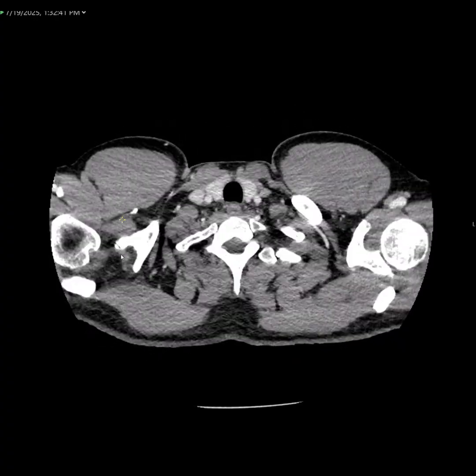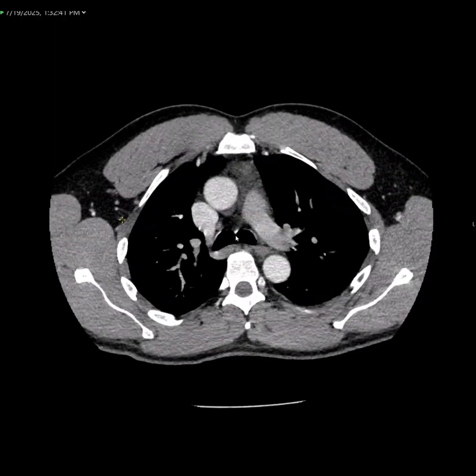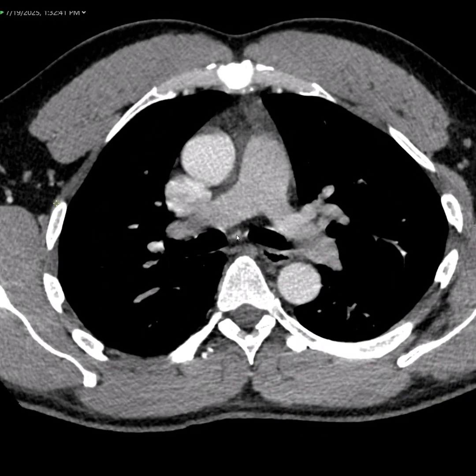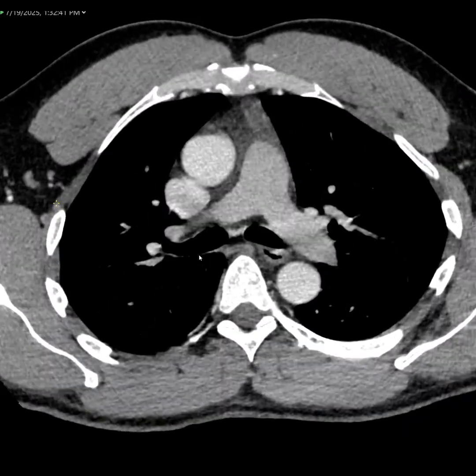Going back to looking for lymph nodes, here you can look at the subcarinal area, looking for any enlarged lymph nodes there. Looking for any other enlarged lymph nodes, I would recommend using a source such as Radiopaedia to familiarize yourself with where the typical lymph nodes are.